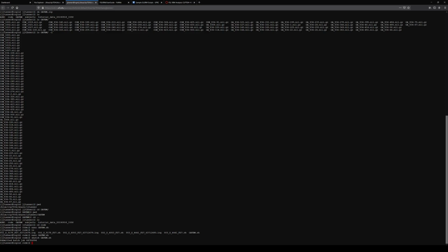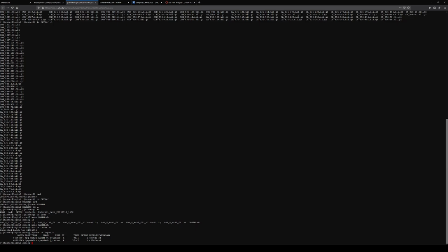And it'll just take a little bit to go. So I can type in a command called squeue -A, and then I can do CLP 7934 for our class. There's a couple things running. Here's my new script. The other one is a console session that I'm running.